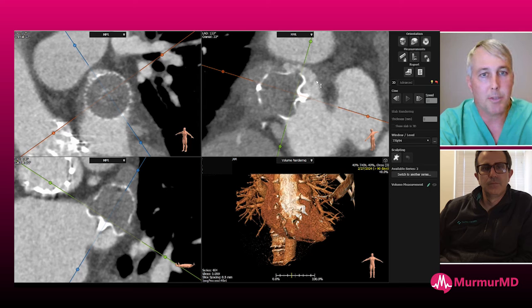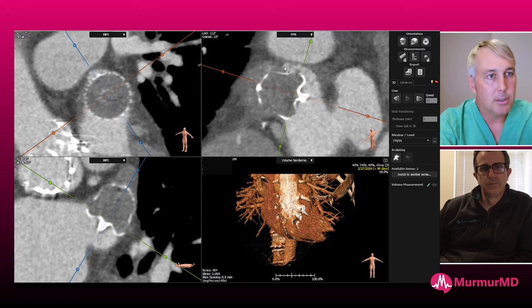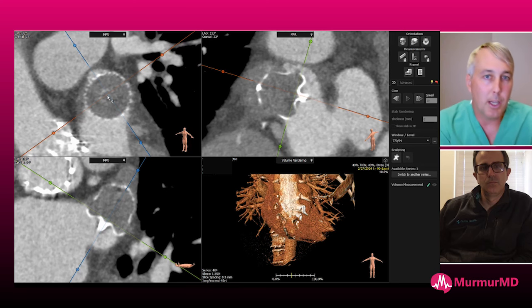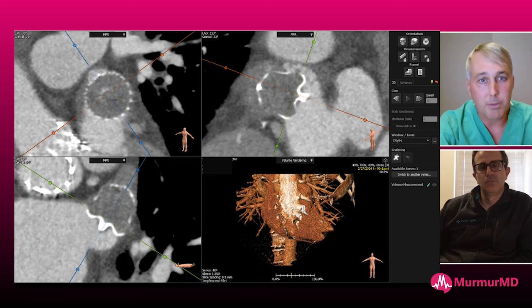And here, first off, you can see that there's the beam hardening artifact around the threaded insert. Sometimes people can confuse that, kind of like we were talking about in the previous case. But what we can see when we scroll around the device is there's this uncovered lobe right here. Would you have seen this in the lab? Hopefully, but this is a leak, and essentially it's an uncovered lobe. The patient has trabeculations back here. So I feel like there is some residual risk of thrombus and stroke from something like this.